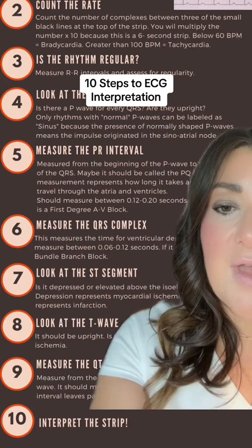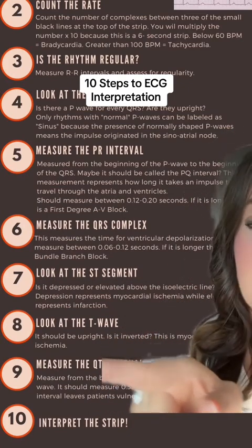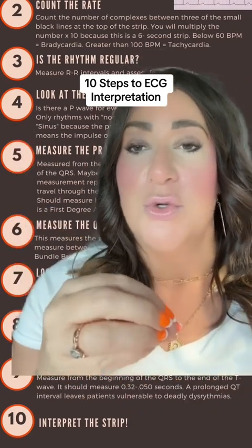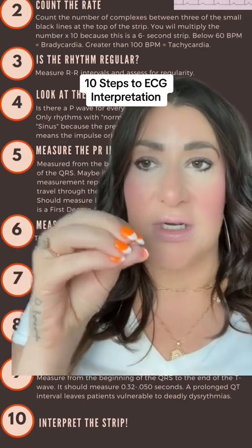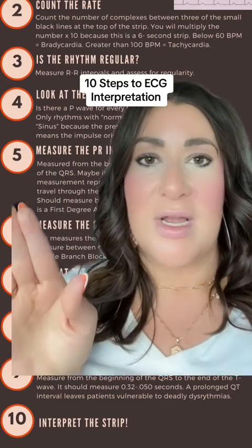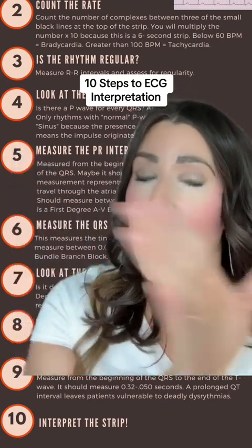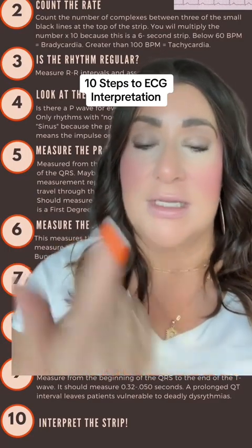If that measurement is greater than, we say, 0.50 seconds, then this leaves our patient very vulnerable to dysrhythmias, because if some sort of electrical stimulation falls on that QT segment, like a PVC, that can send our patient into VFib or VTach. So the longer that QT segment is, the more vulnerable our patient is.